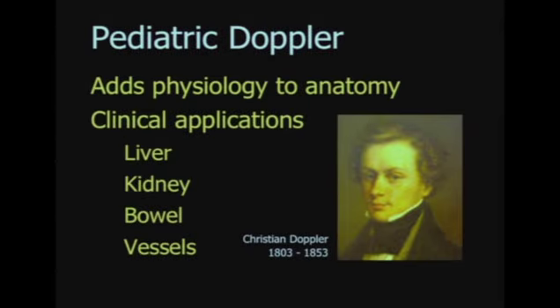Doppler ultrasound is an incredibly valuable tool that adds physiologic information to the usual anatomic information that we get from ultrasound. And during the next 40 minutes or so, we're going to talk about applications in the child in the liver, kidney, bowel, and in the great vessels.